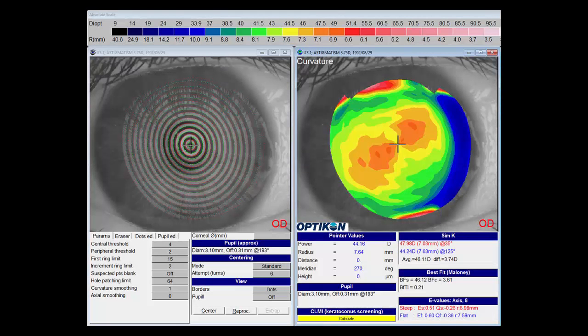Welcome to this video introduction to designing a basic wave contact lens. Now that you've had the opportunity to learn about some of the fundamentals of wave design and you've seen many of the unique features that wave software has to offer, it's time to look at how to put some of those concepts together and actually design a lens. In this video, I'll break down the basic fitting approach into different sections to help walk you through the basic process of designing and ordering a wave lens.